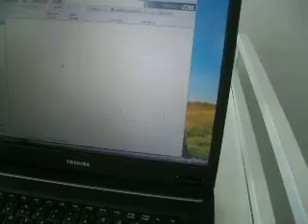So that was a quick start guide how to handle arteriograph. There are some finer little details which you can access from the user's manual of the arteriograph.